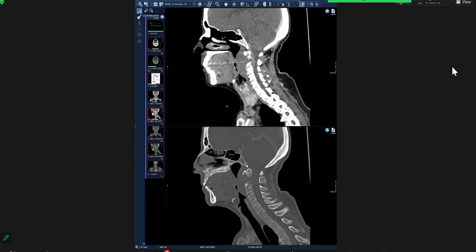And I will inform my findings to the referring clinician and will advise biopsy for the definitive diagnosis. And I will also advise MRI spine to look for any other lesion in the bones, and also advise bone scan to see the multiplicity of the lesion. And if there is no known primary, then staging CT of the chest, abdomen, pelvis would also be helpful.